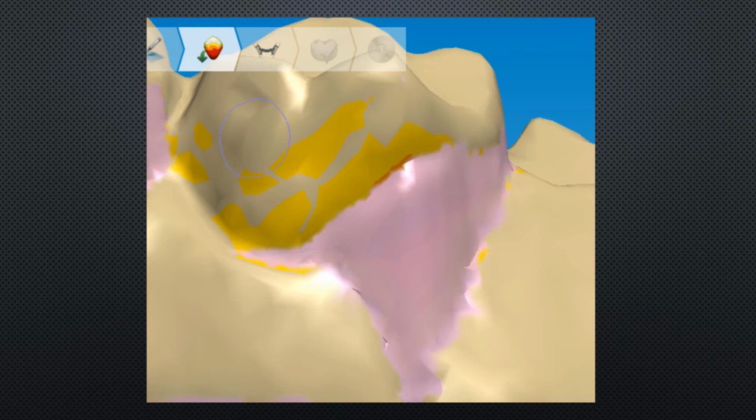But like I said, our clasp is going to come from this side and then around. And so we're going to have acrylic here eventually with denture teeth, and it's going to cease to be flexible. So we need to be above that major undercut. And then we can drop down, on the tip of that clasp, into that undercut.